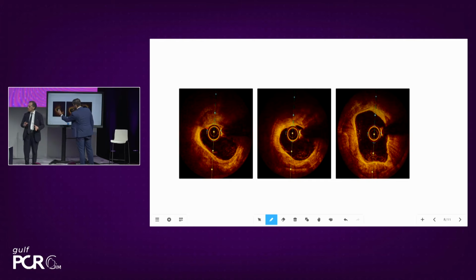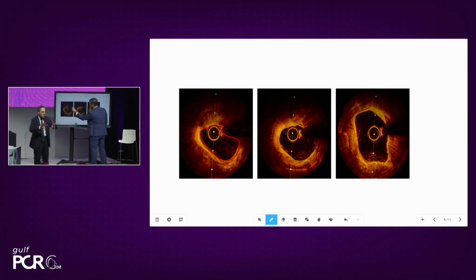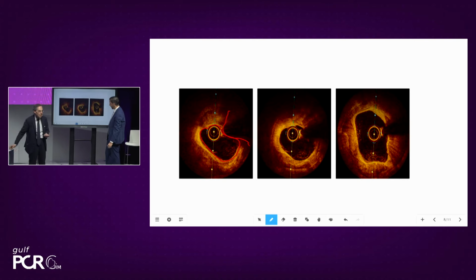Okay, this is quite important to remember: how much the calcium is going not only toward the lumen, but to the outside. Yesterday, there was 20 minutes of discussion about a very nasty distal vessel, and the vessel, based upon the only section with EEL, was very big. So in this case, you have almost all, but you started to have the lumen, and you needed to know that the EEL, in the vast majority of calcified vessels, is gone, because the calcium is not going in one direction, but is going also, as you have seen from pathology, in the opposite direction.